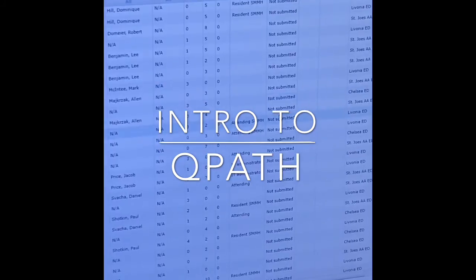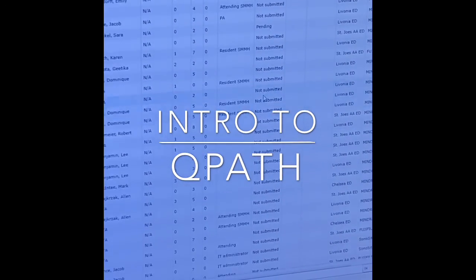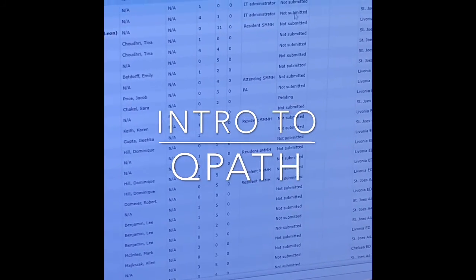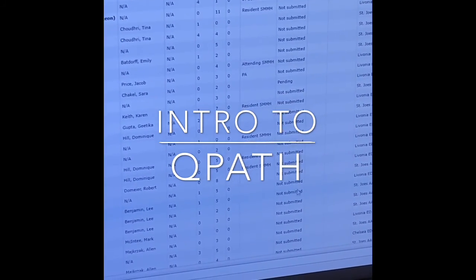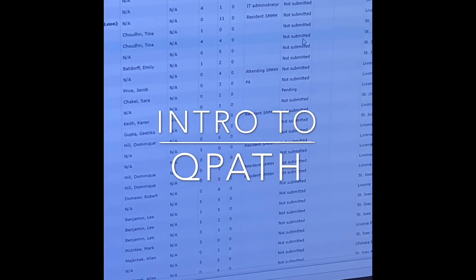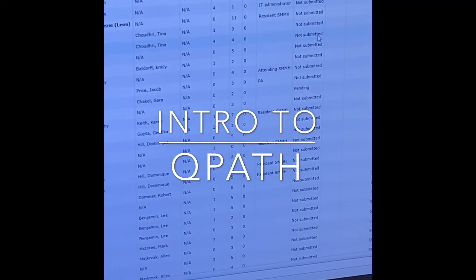And for studies that have been QA'd, they will say complete. As you can see, we have lots of unsubmitted studies. For most users, these are all the columns you need to worry about.